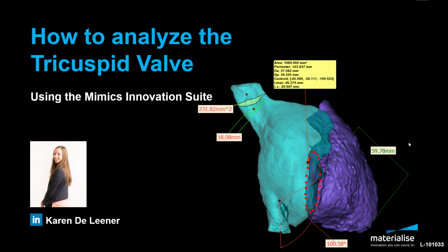In this video I will explain how you can use the Mimics Innovation Suite to analyze the tricuspid valve. The tricuspid valve is located on the right side of the heart, between the right atrium and ventricle. The most common disorder of this valve is tricuspid regurgitation, in which the valve does not completely close when the ventricle contracts. This allows blood to flow backwards from the right ventricle to the atrium, which can lead to a higher blood pressure and even heart failure.